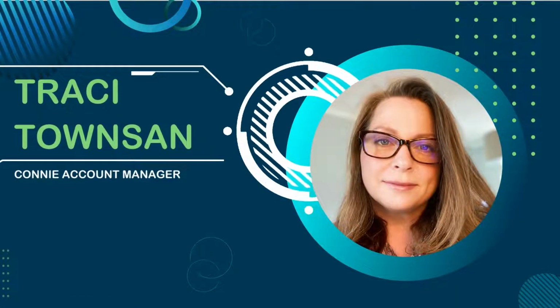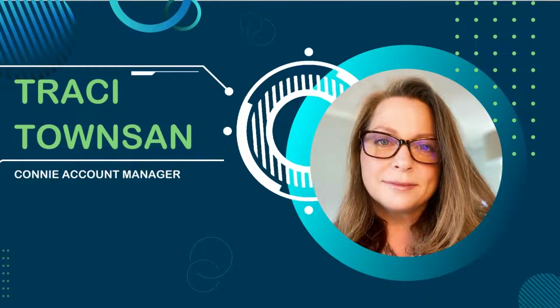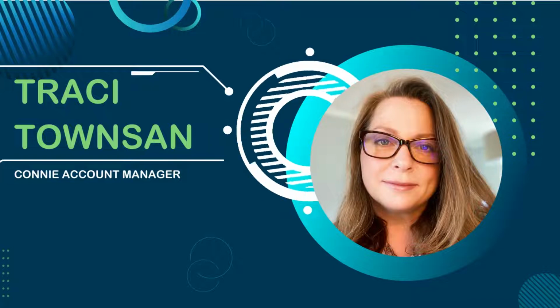I'm an account manager with Connie, Connecticut's Health Information Exchange. In this video, Emily Agumbo, project manager from CRISP Shared Services, will demonstrate how to access Connie's image share.